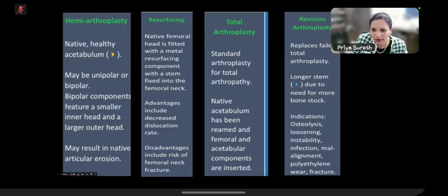We said, what are the indications? We said aseptic loosening, osteolysis, dislocations, infections. Okay, the other ones are the polyethylene wear and the fracture of the polyethylene. Okay, and also if you get ceramic, it can also fracture. So that's the thing we were talking about, different components that we have within the hip joint, the hip replacement or the prosthesis that can be subjected to various kinds of wears, especially because they are going to be there longer because of longevity and because of aging population.